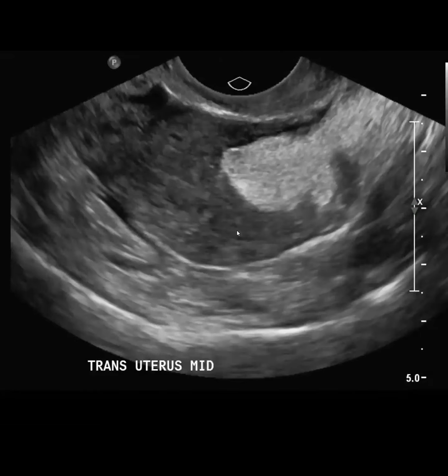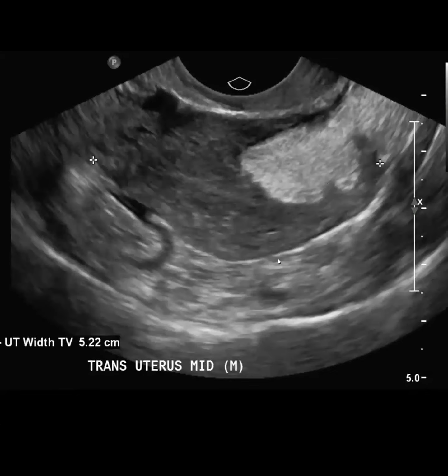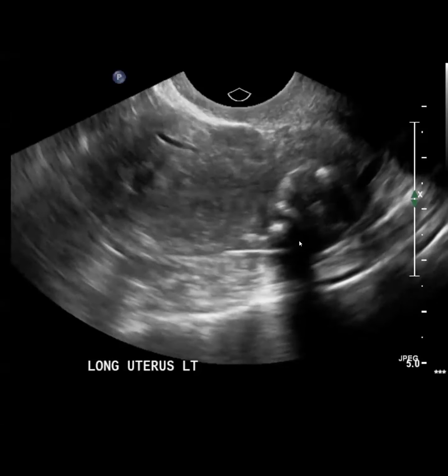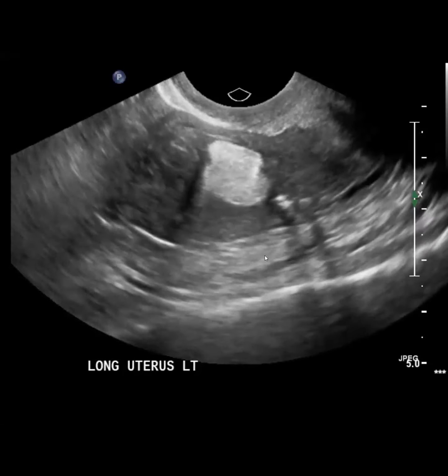And there it is. It's kind of like got a claw sign with the myometrium. But a part of it also extended beyond the uterus. Very echoic, like hyperechoic. Thinking fat. And then this was the cine through the uterus.